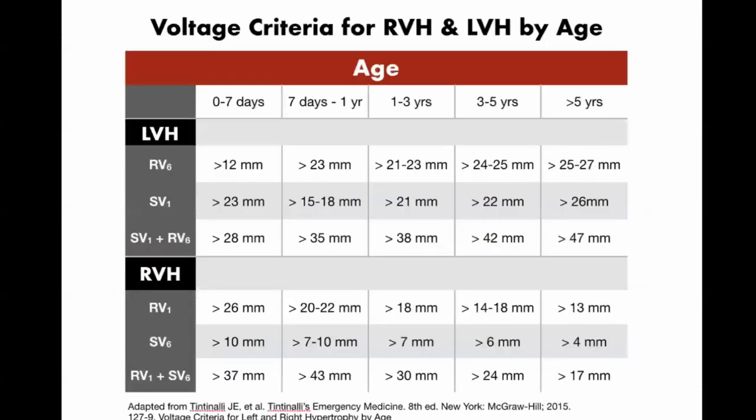When one first looks at a pediatric ECG, one might think that all pediatric patients have ventricular hypertrophy. It's important to remember that the pediatric patient generally has a thinner chest wall compared to the typical adult patient. Because the ECG electrodes or leads are in closer proximity to the heart muscle, it can make the complexes look bigger.